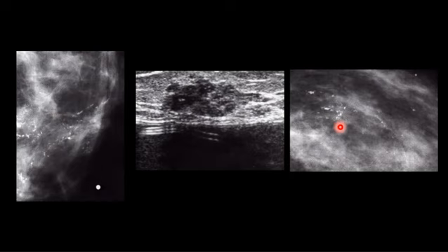Okay. This kind of calcification is suspicious, especially if it was not there previously. The patient is palpating a mass that was not there previously. Sometimes the patient says, I have had a mass for the last 10 years. Okay, that's nothing to be worried about. But if she says, last week I was examining myself and noticed there is some mass, this is the suspicious one you need to be careful about.